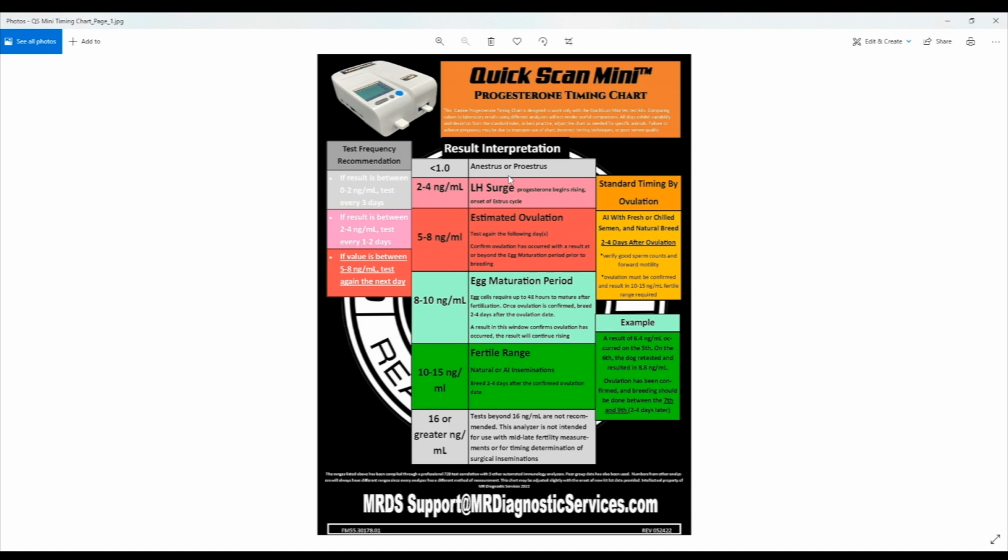So in the middle columns here, we have the major stages of just before estrus and through. We'll start with less than 1, which is basically being out of cycle. There may be a baseline or a small amount in this gray shaded box. However, it doesn't necessarily suggest, even if she is bleeding, that the ovulation process has begun.